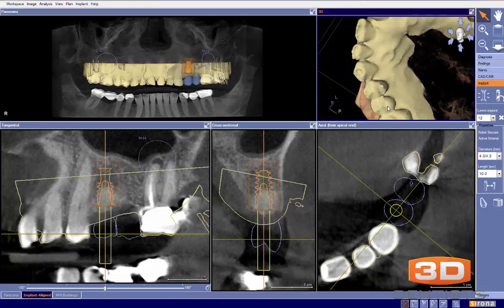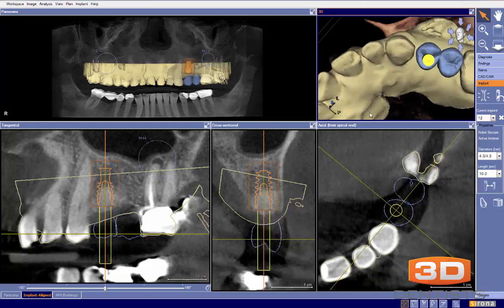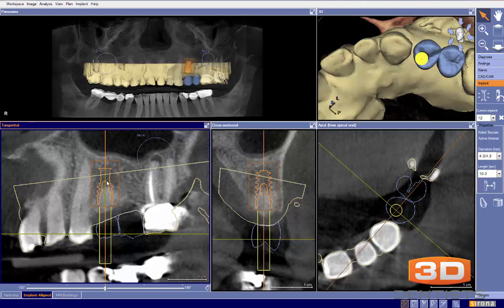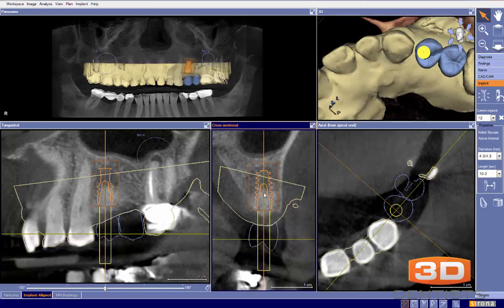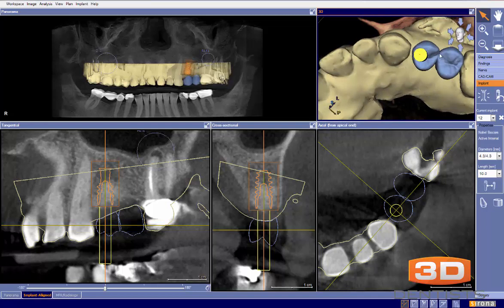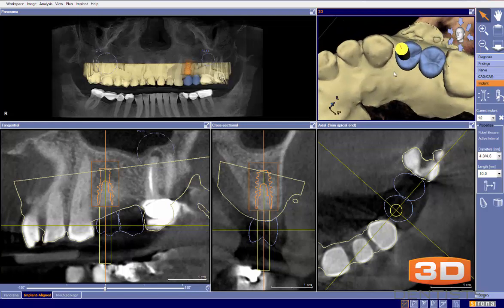Again, since I don't know more accurately where that tooth is or how that design is really going to look, I can base it off these two teeth, and these two teeth, sorry, number 4 and 5, do not look like 12 and 13. So our crown down process is going to be slightly flawed here. I would probably say that this is going to need to look a little bit more like this. Can't get too close to that root. So something along this line right there would be by my bone level, and I would be pretty happy with that plan. Again, I'm being thrown off a little bit by this and the location of my central groove. I'm not certain that that is actually correct.